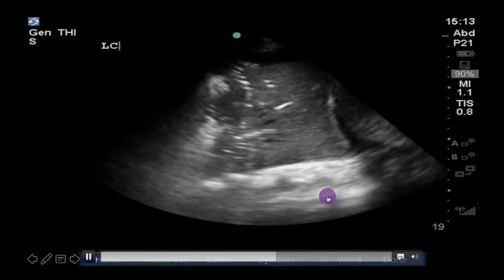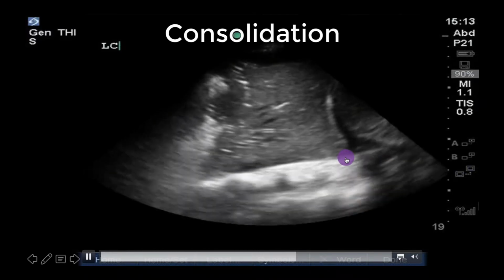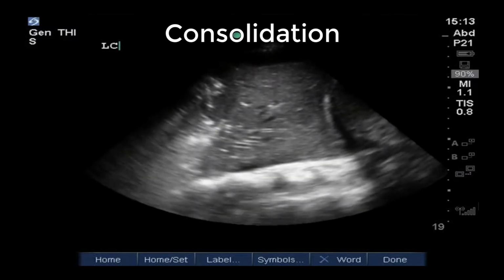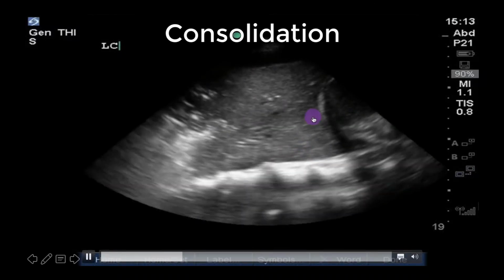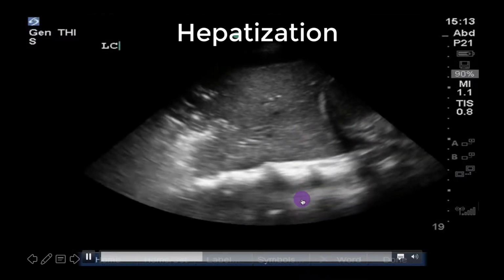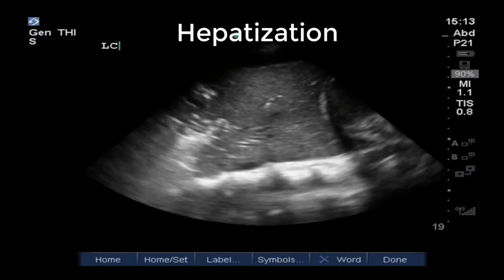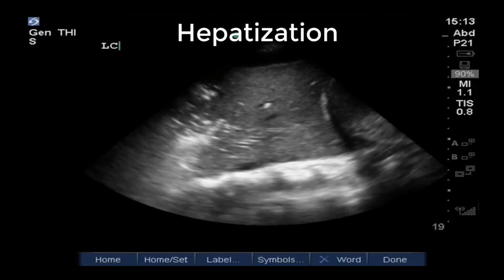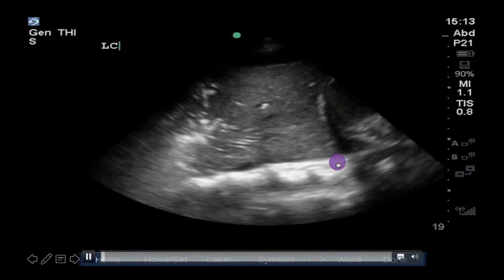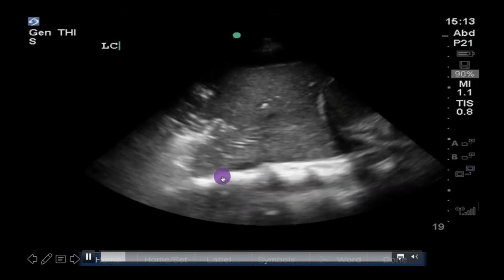Our next lung ultrasound finding is lung consolidation. When this occurs, the lung becomes deflated or filled with fluid and takes on a tissue density. It thus looks gray on ultrasound and is sometimes called hepatization to reflect the fact that consolidated lung looks like liver. In the case of trans-lobar consolidations, the lack of significant lung aeration also allows ultrasound to be transmitted deeper, allowing us to see deeper structures.